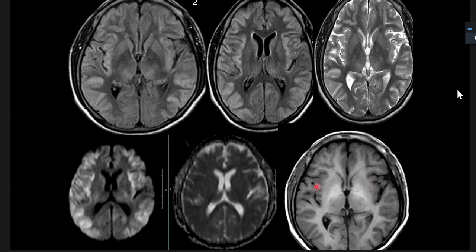Metabolic insult, especially in the presence of T1 bright signal in both globus pallidi, which is due to a paramagnetic substance related to iron manganese deposition, is very common in hepatic encephalopathy patients. So hyperammonemia will be there. So cortical gyral hyperintensity, and as you said, a peculiar pattern is the occipital preservation, which is unlikely in cases of HIE because they have a predominant involvement of occipital lobes and thalamus.